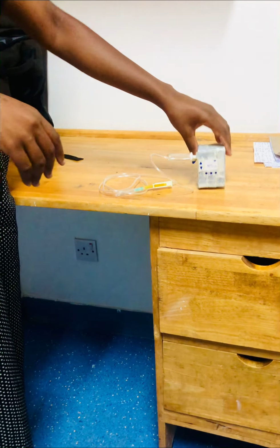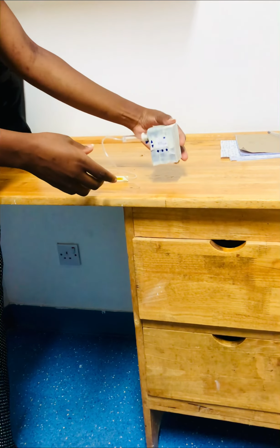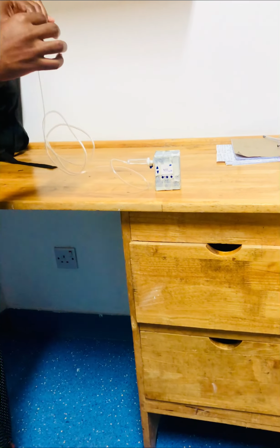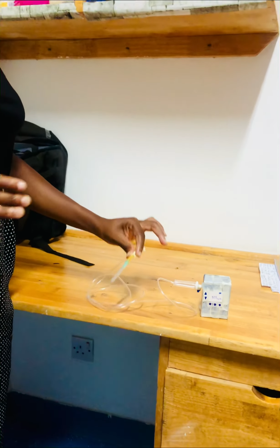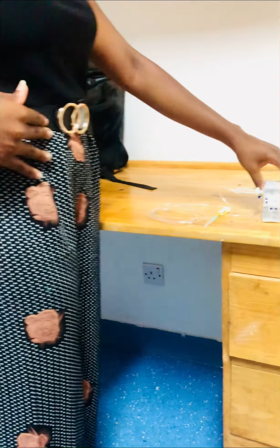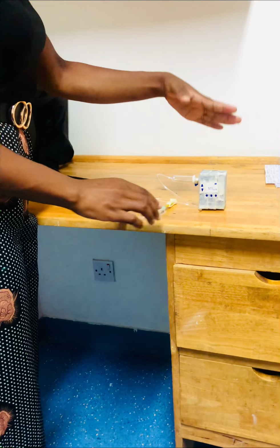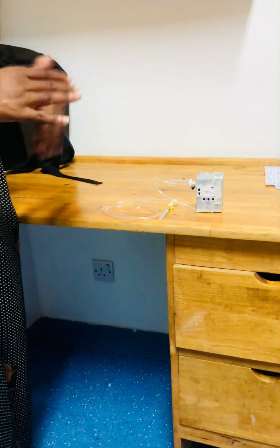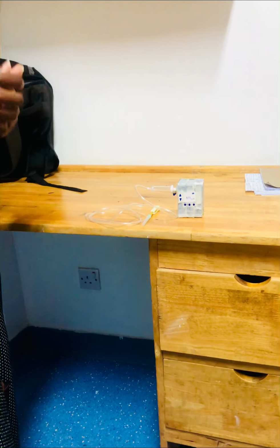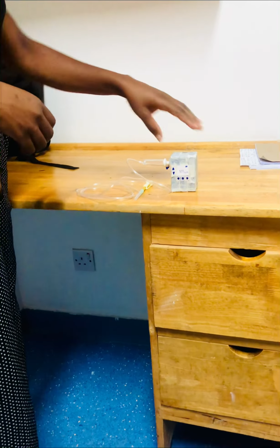As you have seen, this casing is very small and very portable. Someone can carry it wherever they go in their pockets, just making sure that this part of the system is on their body, properly set on their body. So it is very portable, very durable, and it does not use an expensive way of measuring glucose. They can just carry the glucose meter, which is a little more affordable compared to the other systems that are used to measure glucose in the body.